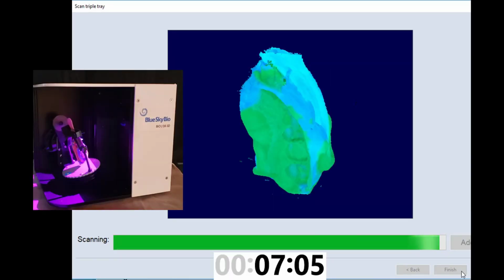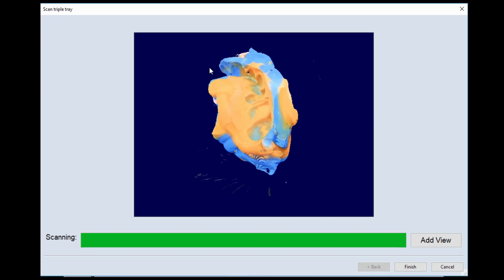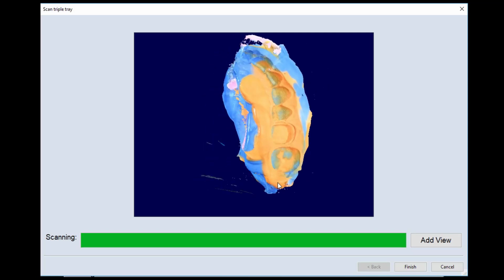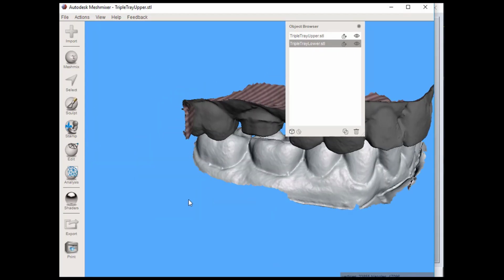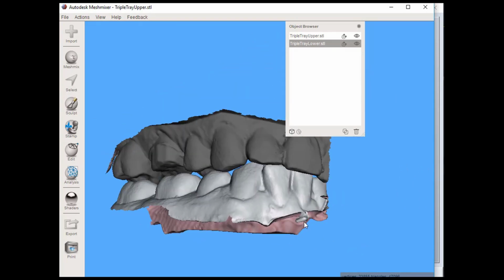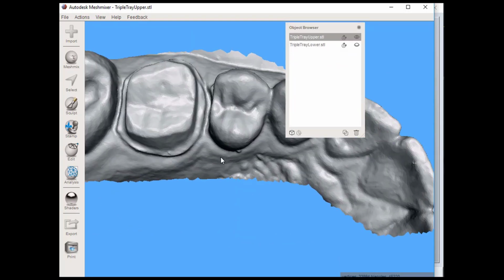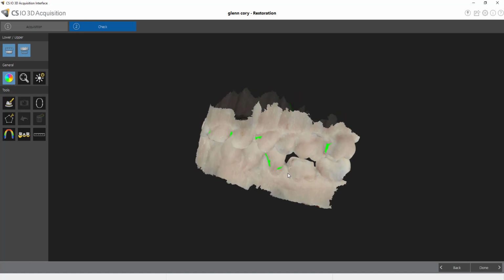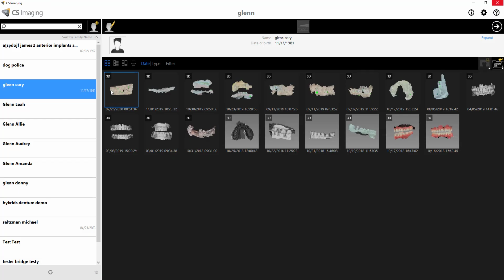If you prefer scanning stone models, it absolutely will do that as well. And this is just a really nice option because this scanner is super affordable. It's only about $2,500. So in the dental world of toys, that is virtually free. So this really should remove all the barrier to entry to get into digital dentistry. But regardless of which method you go with, intraoral versus desktop scanner, the end point is all going to be the same. You'll end up with upper and lower STLs mounted in occlusion to one another.